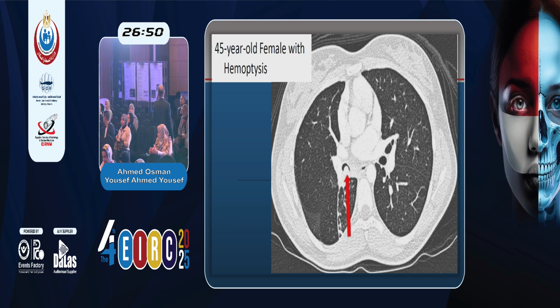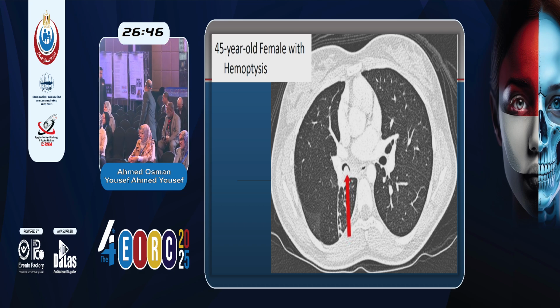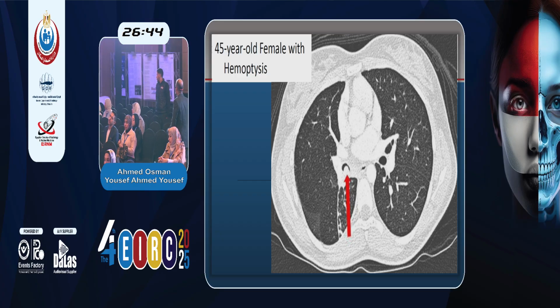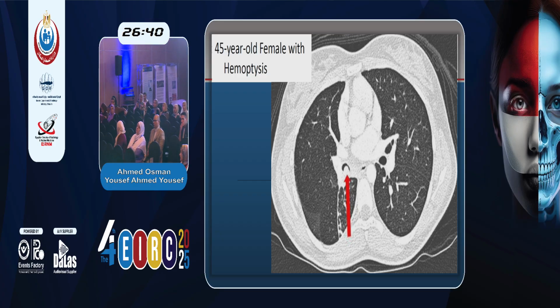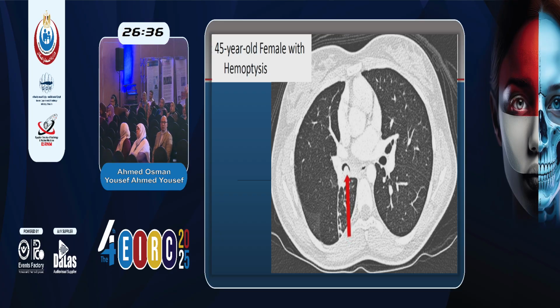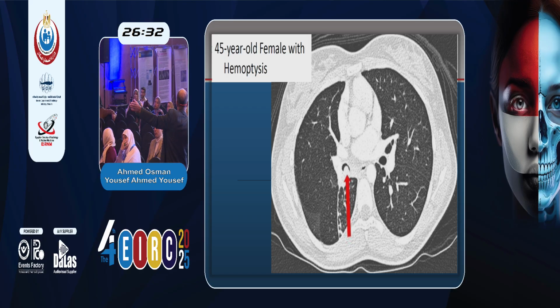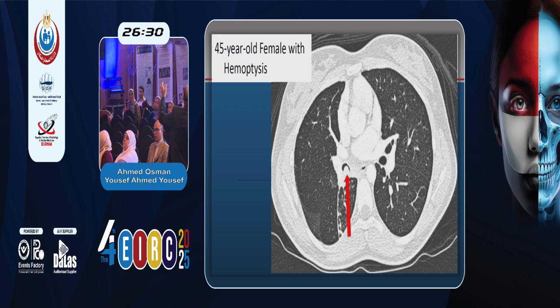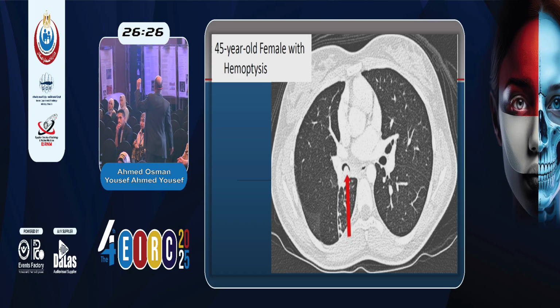Anything else? Regarding vascularity, a very large segment of the lung has oligemia and no good vascularity, or atelectasis. You see the atelectasis? Posterior. Yes, this is atelectasis. Think about this. What is within the bronchus and associated with atelectasis?